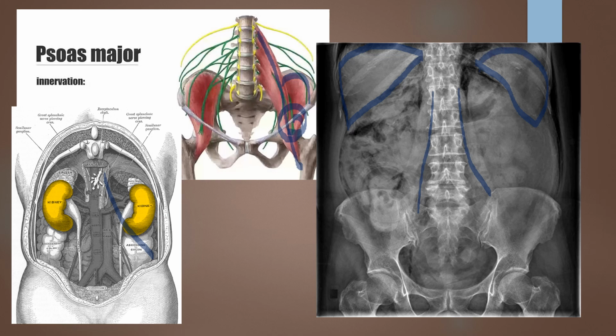Sometimes when you see things a little too well, you have to be suspicious. Over here, I believe that's probably a kidney, a very small one, but it probably is one. The reason we're seeing this is because this patient has a lot of free air in their abdomen. That free air is settling around these organs, allowing us to differentiate between them more easily. So it's a great image and the tech did a great job, but the problem is that the patient has some pathology.